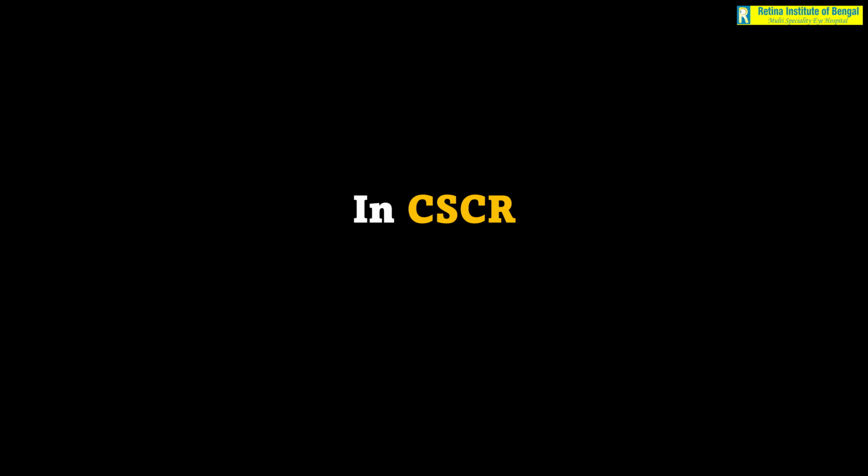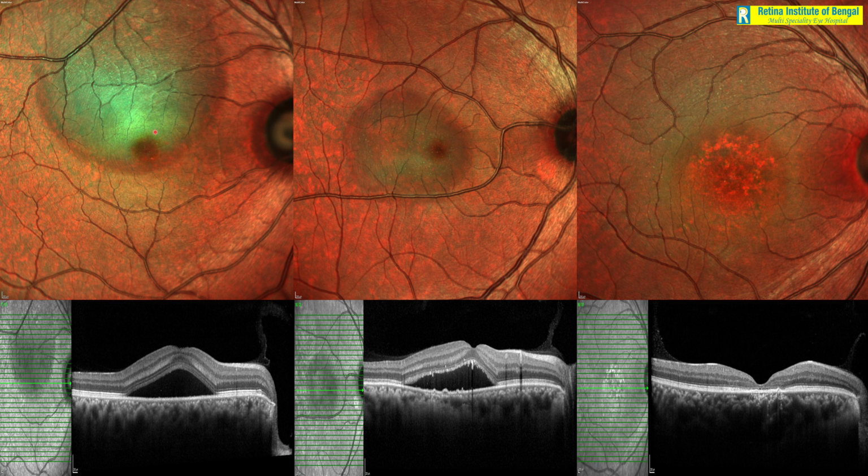For example, in CSCR, here are three images of patients of CSCR. In acute CSCR, when there is only the serous detachment and no RPE changes, you can expect a greenish elevation like this. Now, when there is a retinal elevation, it looks green in the multicolor image, primarily because, for example, in serous detachment, the infrared laser is dampened and the green laser is easily reflected back by the inner retina. So that's why it looks more greenish. Similarly, if the retina is elevated also, it will look greenish.